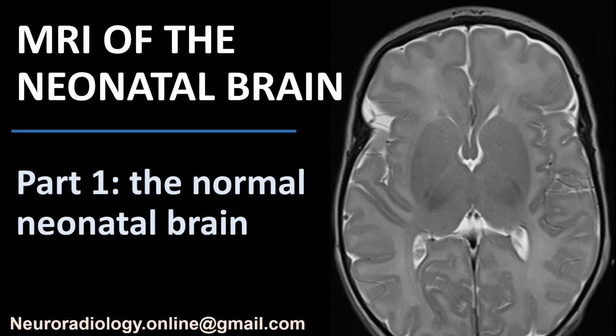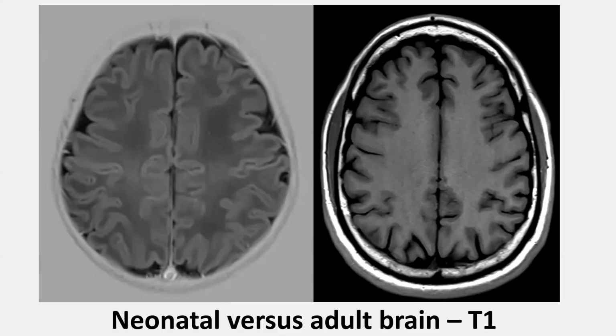And to be able to recognize these entities, you have to know what a normal neonatal brain looks like. And that is what I'm going to teach you in this session first. What does a normal neonatal brain look like? Because it looks totally different, as said, from that of an adult brain.